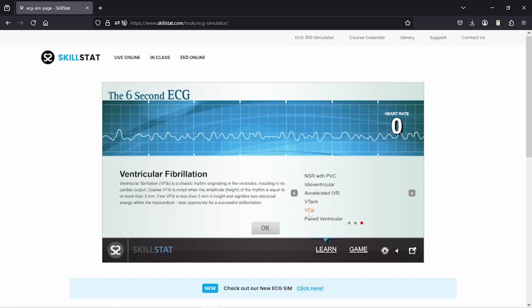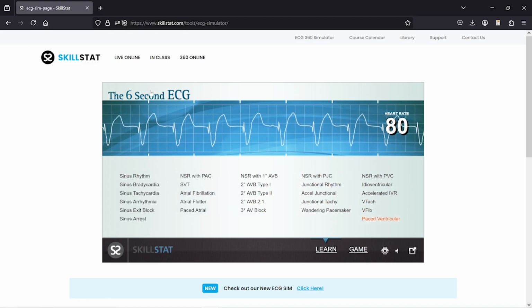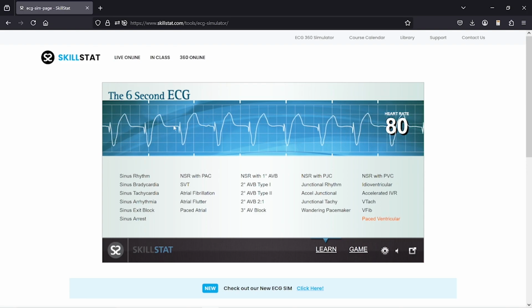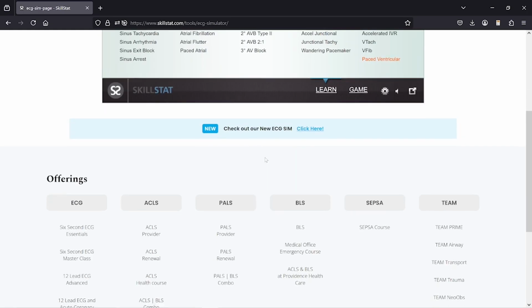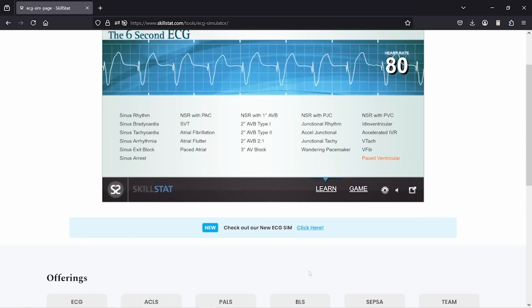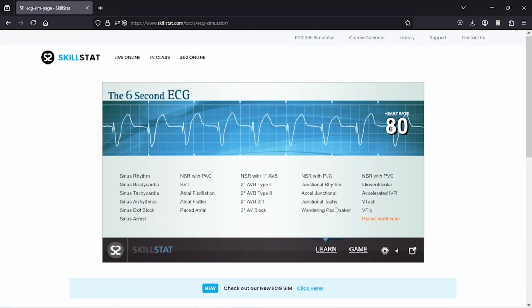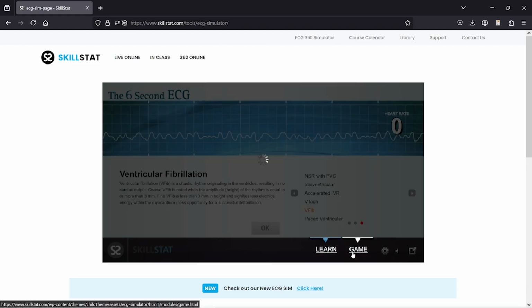So I'm going to go ahead and mess around with it a little bit, and I would highly recommend you check out the link. I'm going to leave a link for it. It's a free EKG simulator, and they even have 12 leads now, which is so cool. They also offer a couple classes as well. I've never really done any of the classes, but I have a huge respect for what they provided for the medical community by offering such a great practice tool.